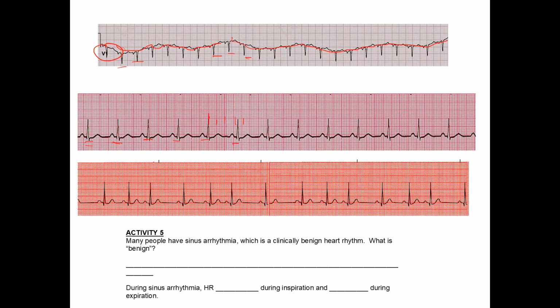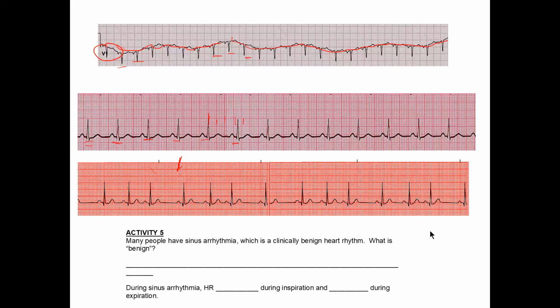This is the one I really want to show you today before we go and really understand what's going on here. So take a look at this one for a couple of seconds, 10 or 15 seconds, and see if you notice anything. Okay, so what do we find out? First of all, is this regular? If you did your calipers and moved them over, would they line up all the way across? No. Excellent. You're 100% right. So it's irregular. Everybody agree?